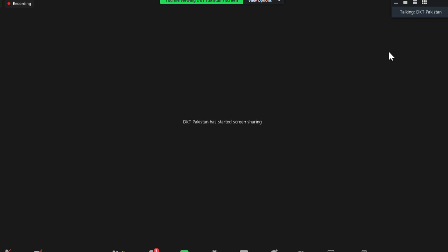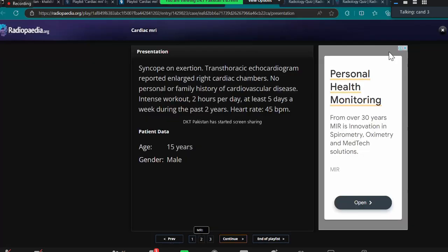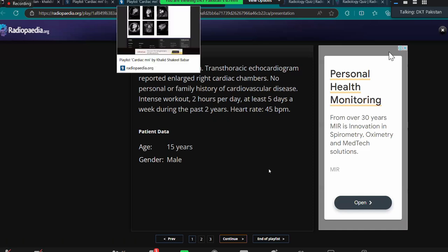Okay, can you see my screen? Still it is showing that you have started. Yeah, now I can see. Okay, can you read the history?